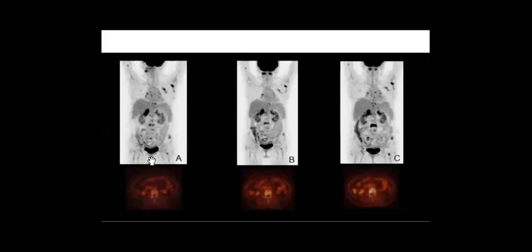So this patient has what is called recurrent disease, maybe in the osseous and left axillary, and maybe lymphadenopathy as well, and there is maybe lung. Sure, we need the CT and the axial images, PET-CT images to see where exactly, but at least you can tell that this patient has recurrent disease here, right?